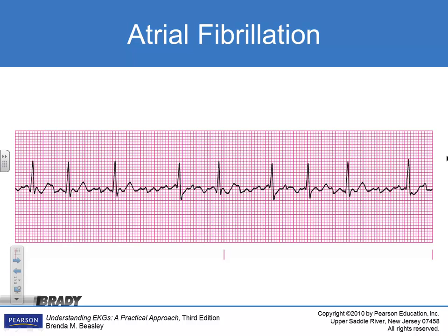Always irregular. AFib. Can you see P waves in here? Those are F waves in there. You may see this and think that's a P wave. You can't measure a PR interval there, can you? Not really. There's no line there. It just happened to land there and look almost like a P wave, but that's an accident.